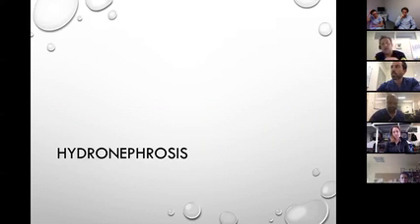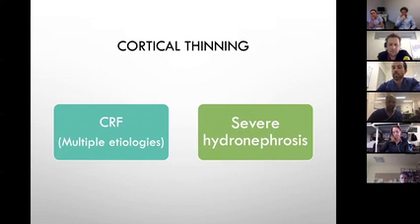All right, move on to severe hydronephrosis. That's probably the first thing you need to look at. So far, normal things. Any questions about it? Sorry.